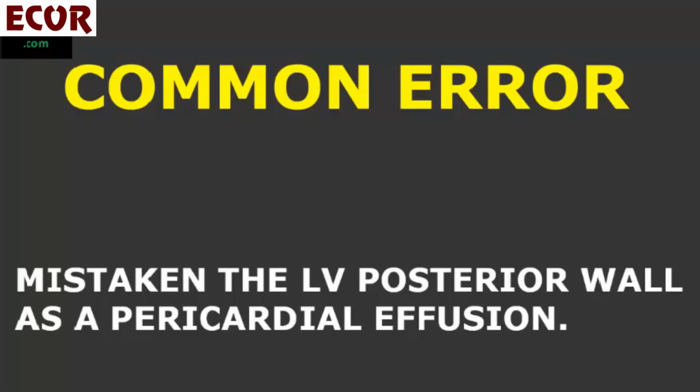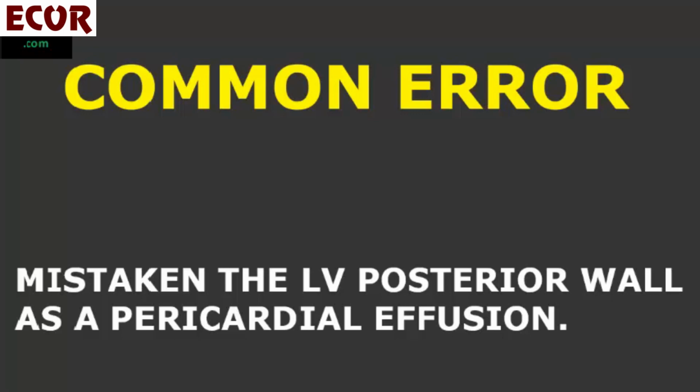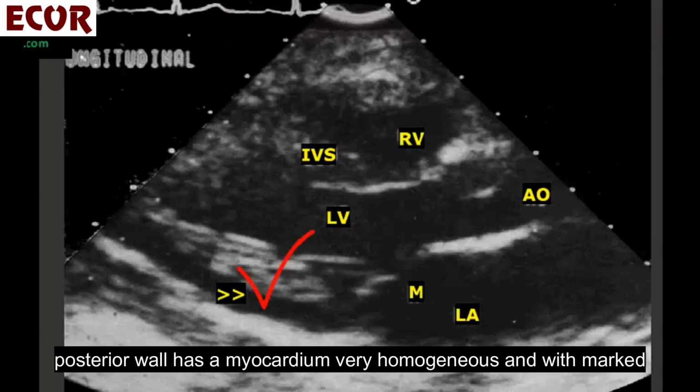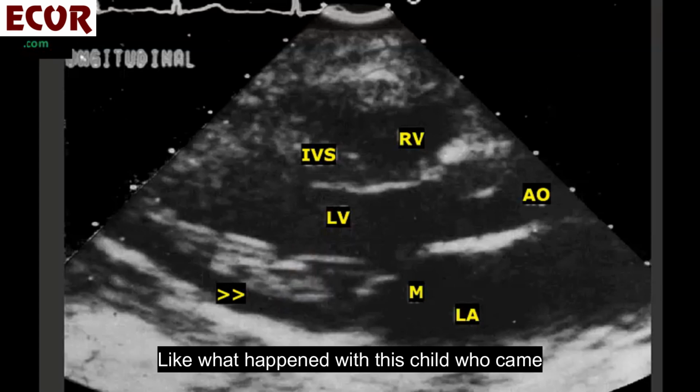Common error: mistaking the left ventricular posterior wall as a pericardial effusion. This happens because in some patients, the posterior wall has a very homogeneous myocardium with marked hypoechogenicity, which may be mistaken as a pericardial effusion. Like what happened with this child who came for a study because an outside performed echo had diagnosed a pericardial effusion.